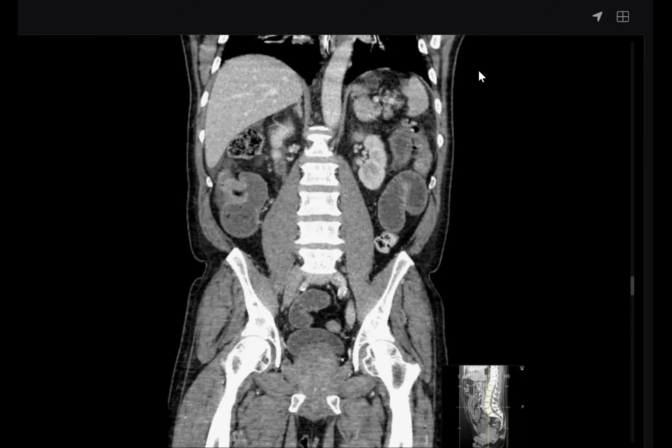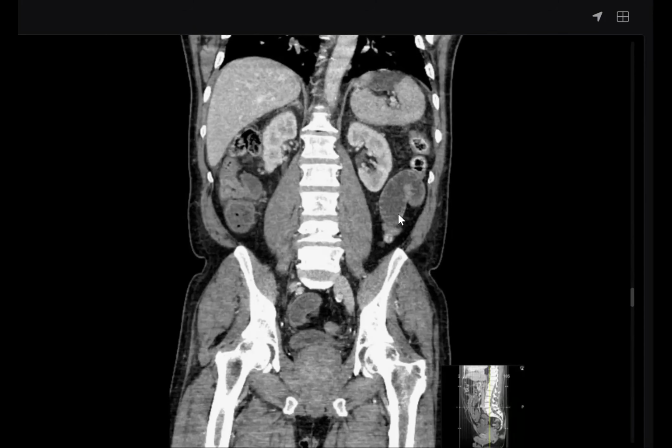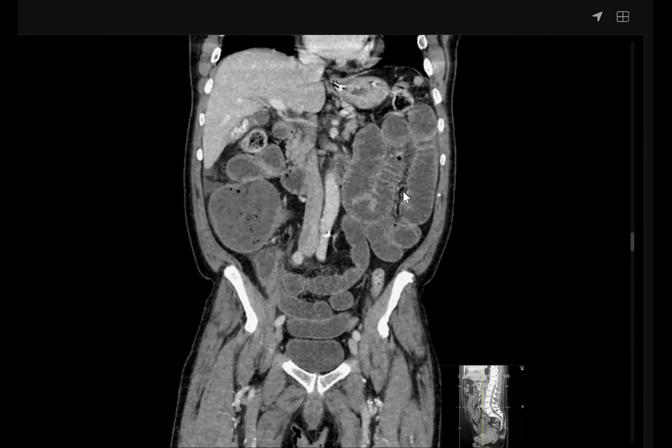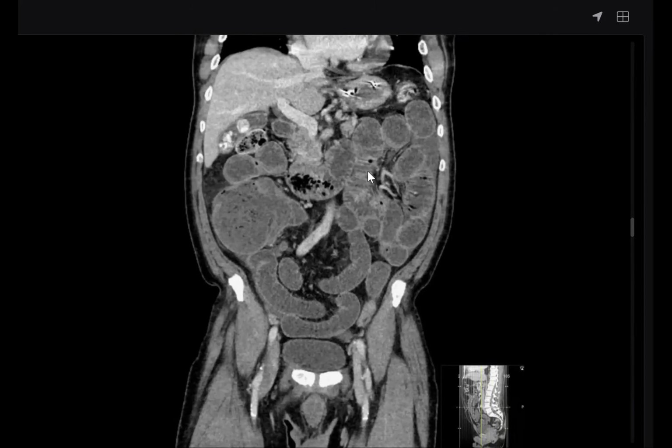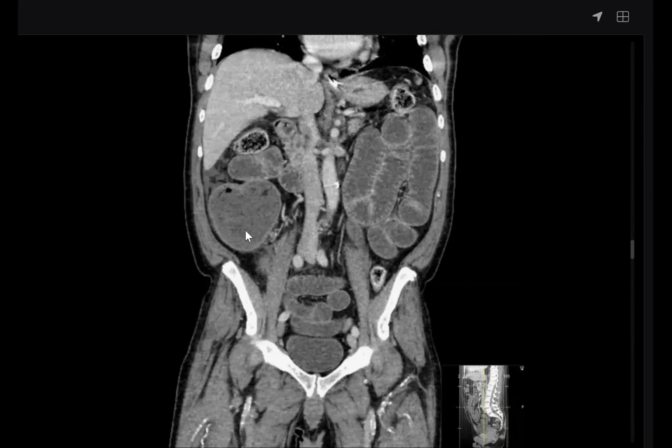Endoscopy, histopathology, and CT staging of the chest, since I imaged the abdomen. Yes, very good, my friend. You managed this case excellently. When you see a bowel dilatation, first determine the type. Okay, it's a small bowel. Now we also have a segment of large bowel, which has a different type of causes.